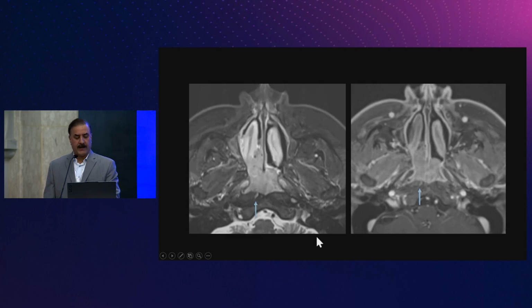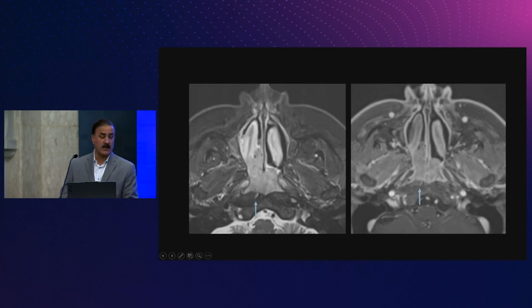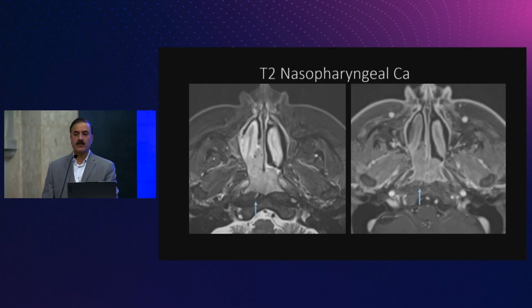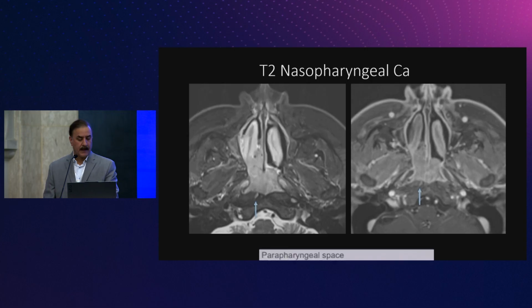Okay, moving on. Now again, nasopharyngeal carcinoma, extending into the nasal cavity, very clear, T1, but you have this wispy T2 signal with some corresponding enhancement within the longus colli capitis muscle. Prevertebral muscle involvement makes it a T2 nasopharyngeal carcinoma.